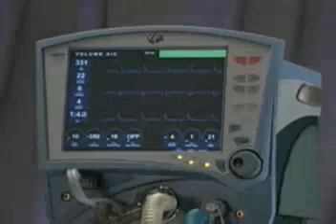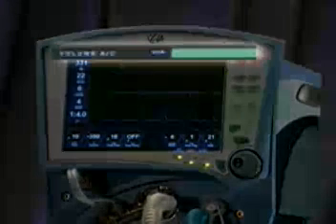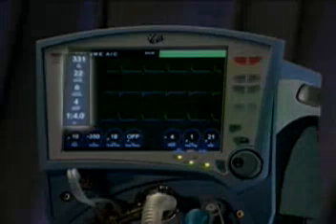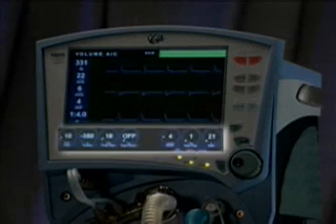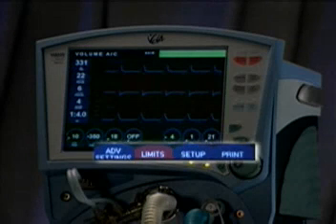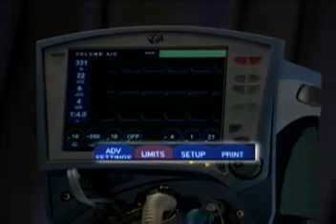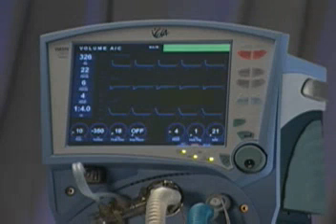The user interface is divided into 6 distinct areas: status indicators, monitored parameters, graphics, control settings, messages, and on-screen buttons. Status indicators provide information about ventilation settings, give access to other screen displays, and alert the operator to alarm conditions.